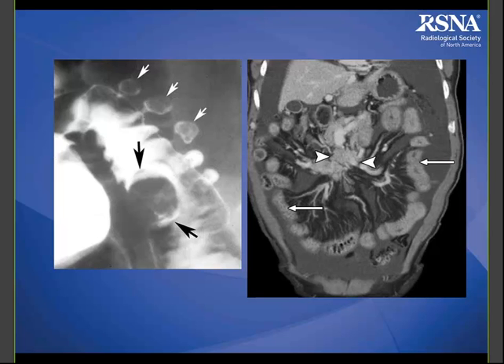And here is just an example. Obviously, there's some diverticuli, but an intraluminal polypoid mass in the terminal ileum. And then on the CT exam, we can see the classic spoke wheel kind of radiating spiculations of this mesenteric mass, a lot of edema, fluid in the mesentery, and some associated bowel wall thickening. Very classically carcinoid.